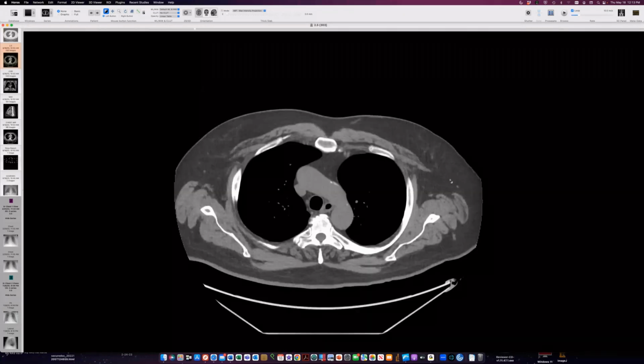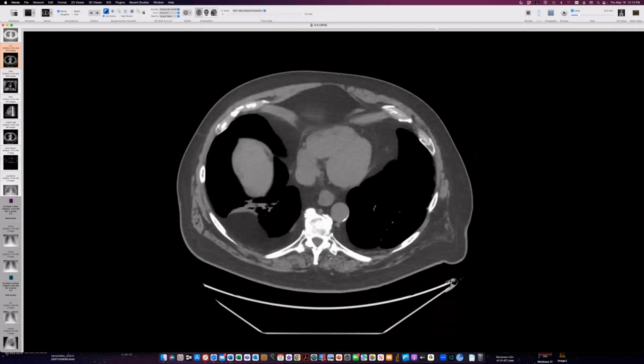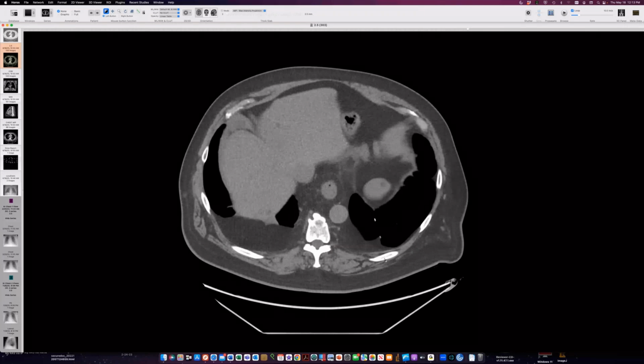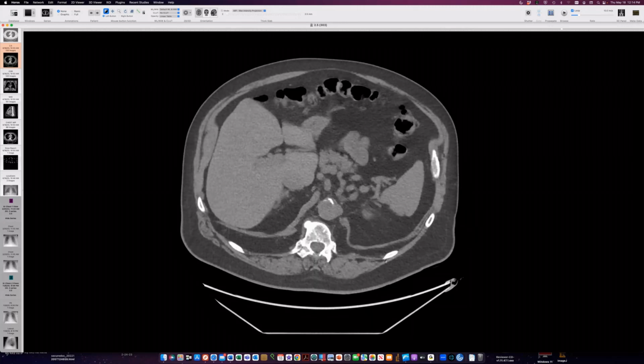And we'll see that there's a massive amount of fat back here that looks to me as if it's sort of flowing out into the pleural space. So how are you supposed to get fat? Because there's no fat natively in the pleural space. Where did it come from? And the answer is that this person has bilateral so-called Bochdalek hernias.